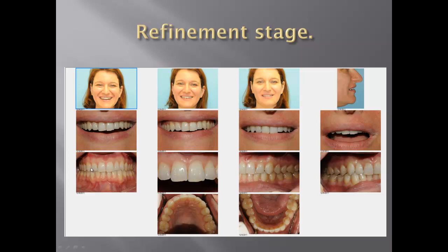My point is that I'm trying to put number 6, number 8, 9 and number 11 at the same gum level, and number 7 and number 10 a little bit lower. If, for example, I establish the bite and even the position of the gum, I might probably do just incisal edge bonding, adding composite or a laminate, depending on what the patient wants at the end. But that's what my stages are to achieve the result, especially in this case.